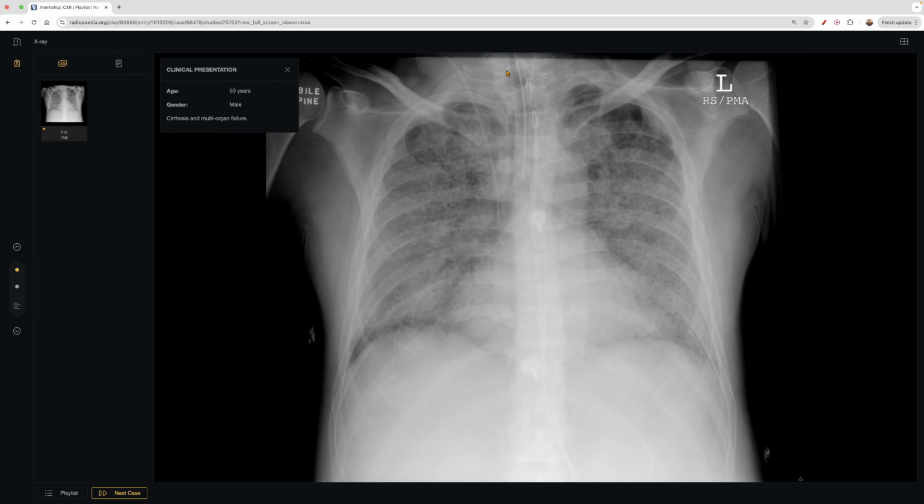And you can actually see here in their trachea, right? If you did your search pattern, you can see there's a hyperdense structure. There's a structure in the trachea that makes it not so aerated. And this patient's intubated. This is the endotracheal tube, okay?